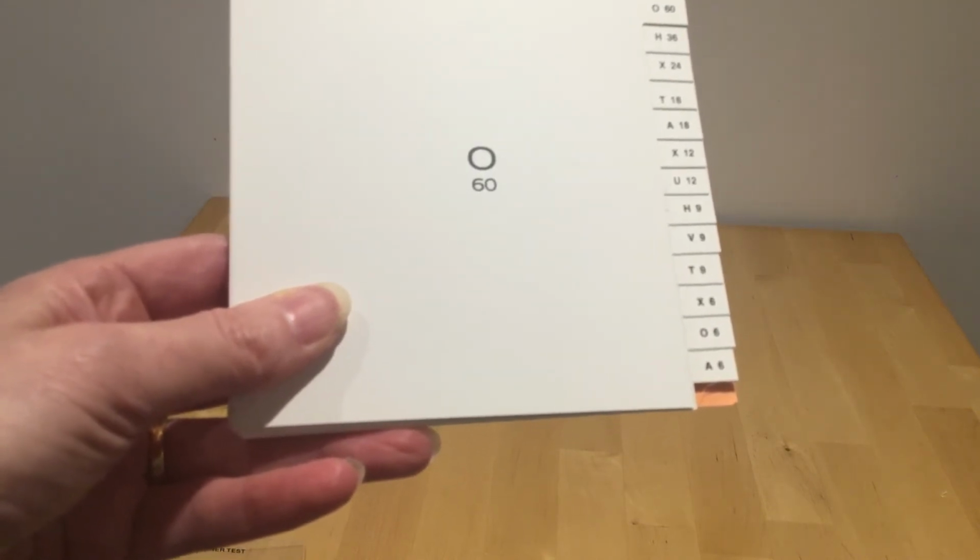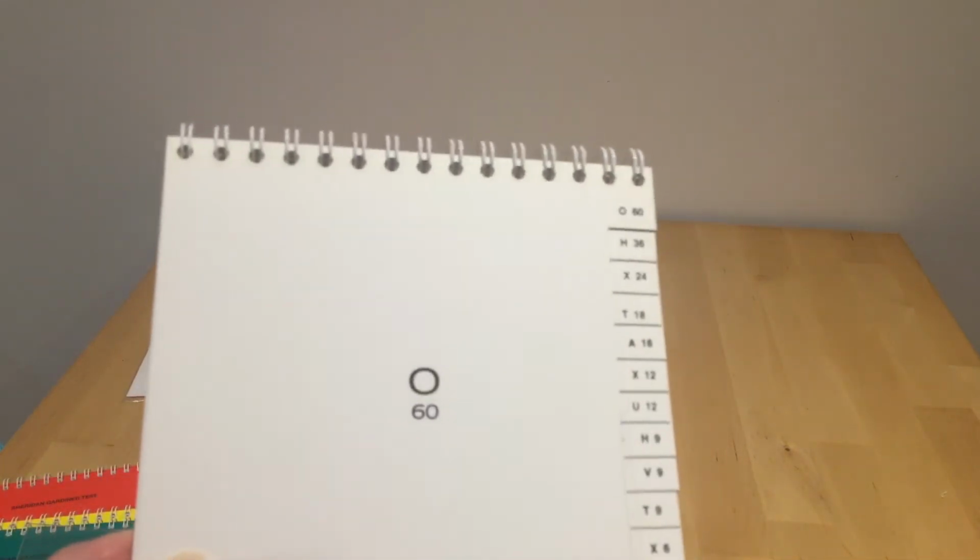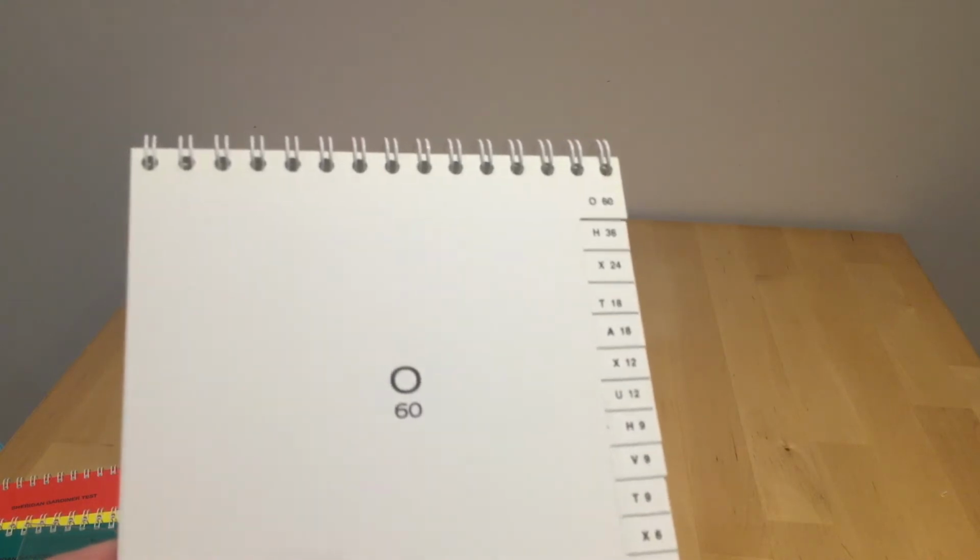and 3 at 6. So if you don't have very good visual acuity, and you're only going to have one opportunity to guess the letter at 36, it's perhaps quite a crude and blunt instrument to actually assess distance vision. But that's it, it's the reduced Sheridan Gardner, and only one booklet as opposed to the 3 in the original.